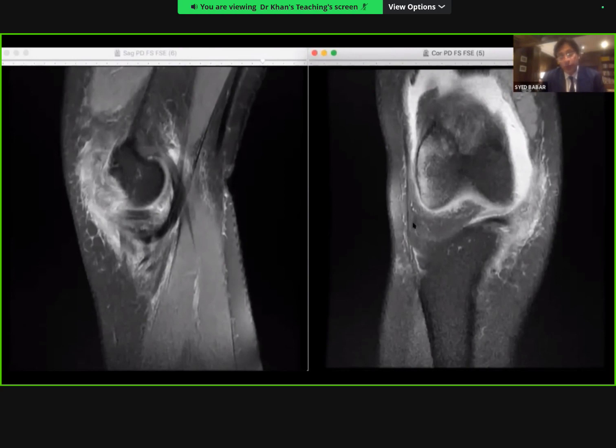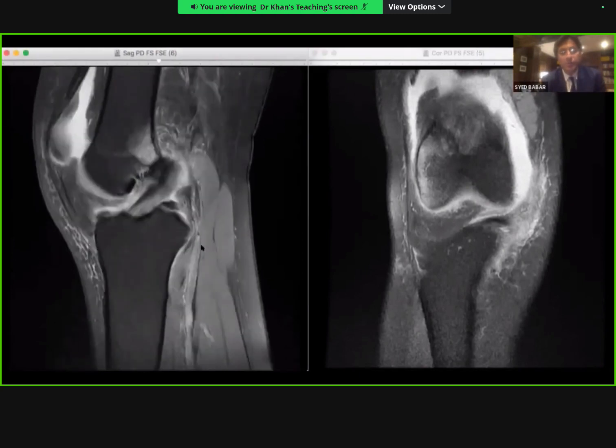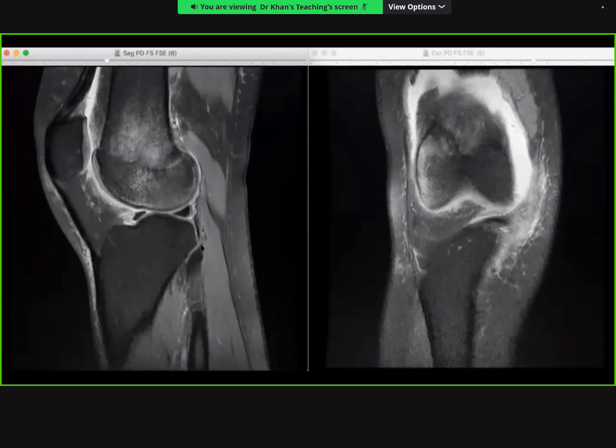So good, you did very well in the sense that you quickly picked up the things that I've just noted on the previous MR. So you're going through the same routine, which is excellent. However, if somebody had a dashboard injury, where would you expect the contusion to be? What does dashboard mean? Usually that would be patellar bone marrow edema with the anterior tibial.